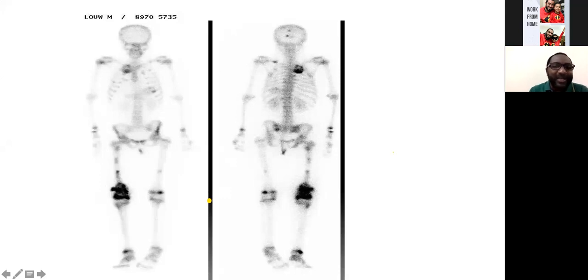But in this patient, additionally, apart from identifying the area of intense uptake at the primary site, you can see from head to toe that there is a focal lesion here. There is one around the neck of the humerus. There is one around the costal region of the rib. So you can see the sacroiliac joint. There is asymmetrical uptake. So there is also intense uptake, and you can see also in the distal part of the humerus. So this patient has a widespread skeletal metastasis.